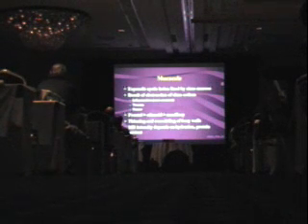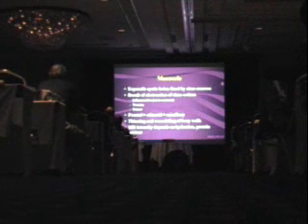Again, expansion of bone, but not lytic destruction, homogeneous cavity, formed by, just like the ranula, obstruction of the sinus ostium, more common frontal, less common maxillary. Signal intensity is usually uniform, but depends on the hydration. And don't get faked out if there are all these little bones in here. It could still be a mucocele and kind of grow around some of these paper-thin bones in the ethmoids and the sinuses.